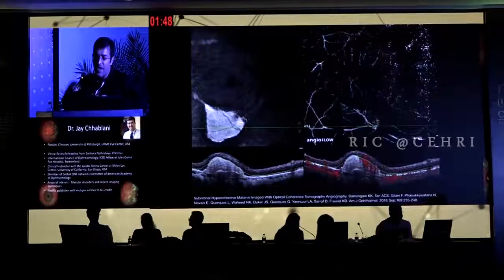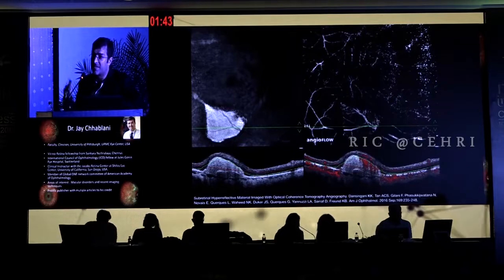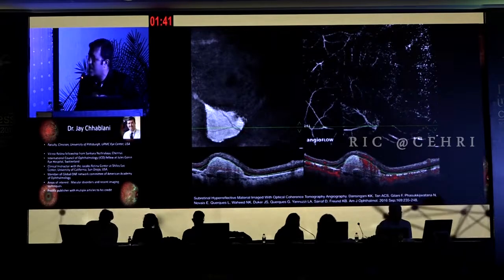If you look at this image, you will see that we can see some vascular information in the inner part of this scar, where you can see this area. You may get confused by thinking that this could be neovascular tissue, but you have to remember that this is actually a projection artifact which is happening in the anterior part of the scar. So you understand that you have to correlate with the projection artifacts as well before you take the decision that this is vascular data.